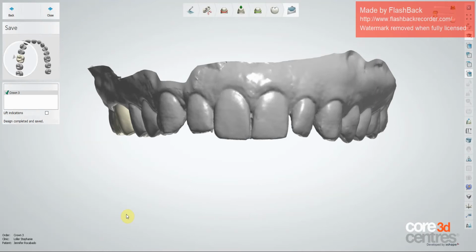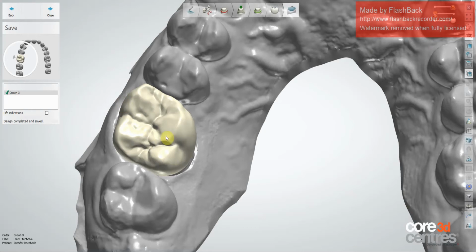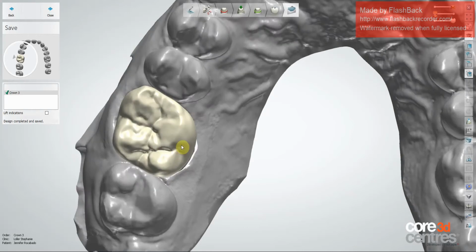My library, the one I like, the Custom 3, is a library that I've spent years on. I've designed with it for probably a year and a half, but it's been in the back of my brain, and I've designed it like this every time I designed a tooth. Then I decided one day just to make it perfect.